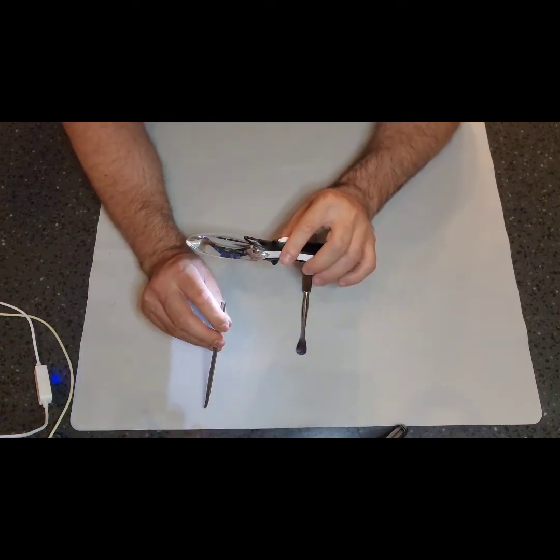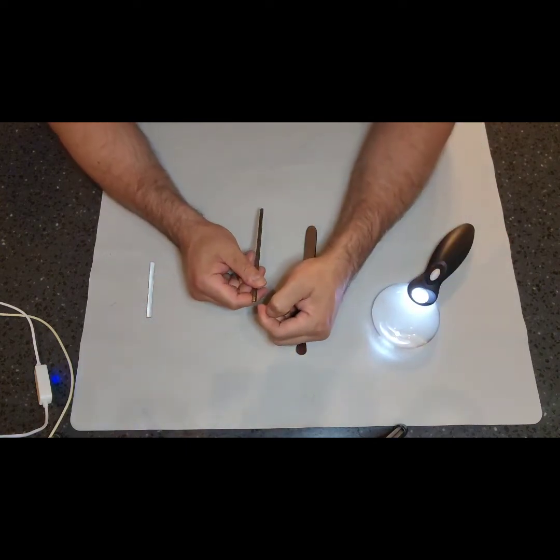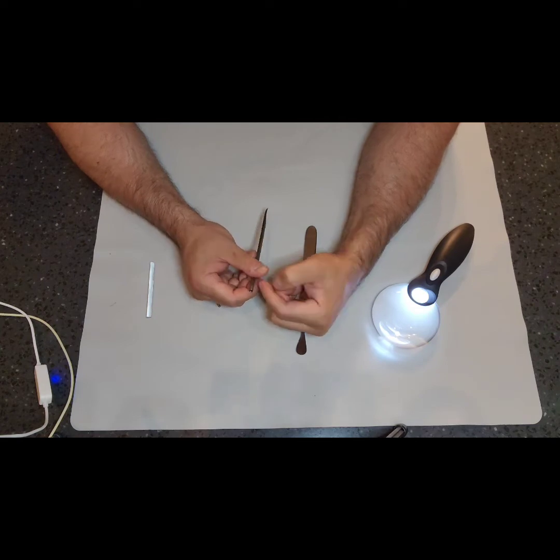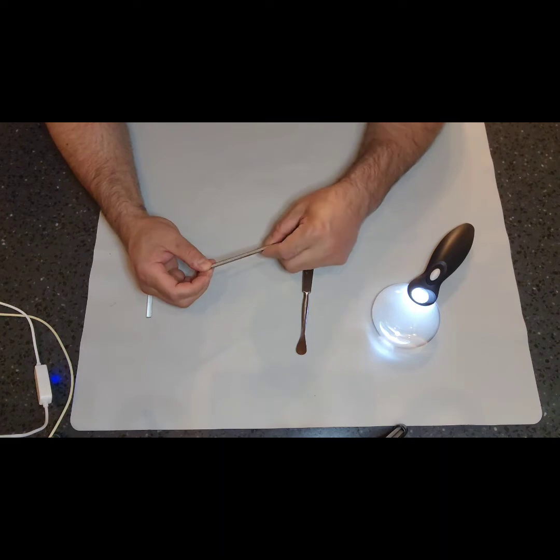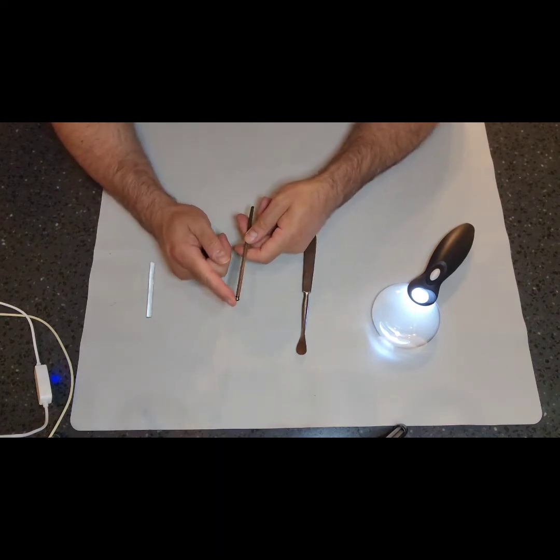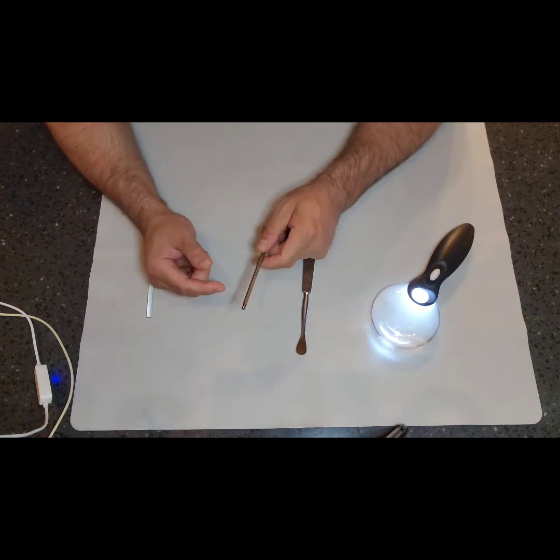You want to look in there to make sure that there's no debris in there. If you have a borescope, it'd be nice to go down there and look to see if there's any discolorization, rusting, or baked on or packed up soil in there. That'd be a good opportunity to do that. Okay, you don't want the parts lost, so you want to loosely keep that on there. Check the IFUs to see if you have to sterilize it removed, or you can just lightly place it back in there.